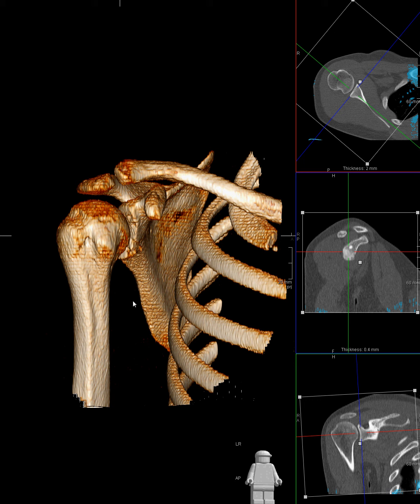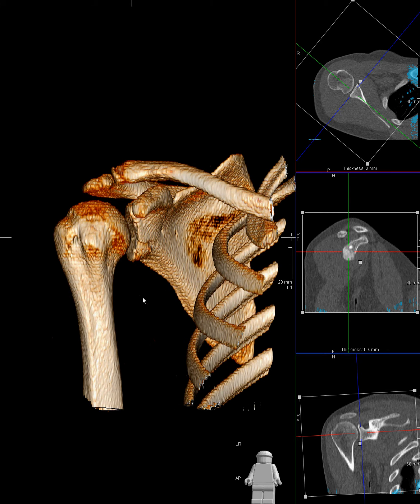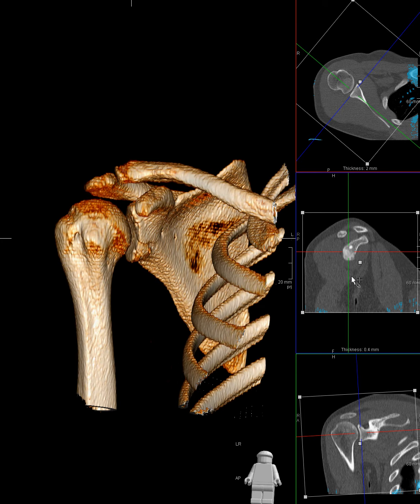I wanted to give an example of what surgeons are looking for from 3D images of the shoulder. I'm sorry if some of these images don't come out that clearly. I'm using 2mm slices to reconstruct these in the 3D imaging. First, let me look at these images here on the right, which show the kinds of planes that we want to get, first of all with 2D MPRs.